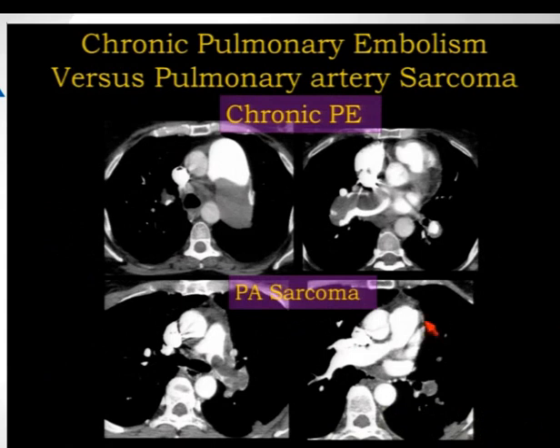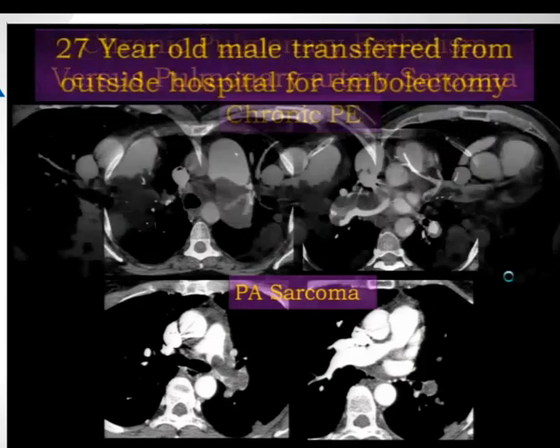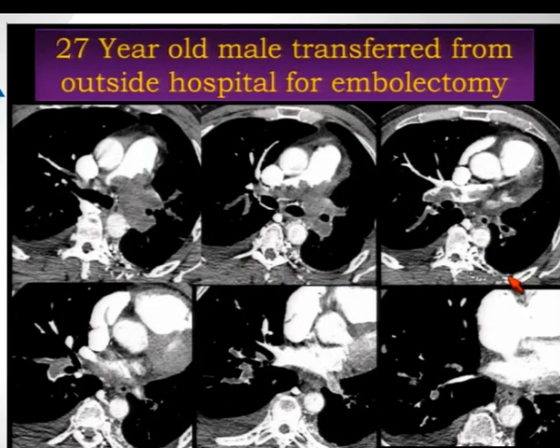They may have subpleural nodules or consolidation or pleural effusion. And I'm just showing you these two together. Some have said that pulmonary embolism tends to be smoother and show no enhancement. This may or may not be so, but that's something that you can use. This is a patient who I fell into the pit on. This is my Waterloo, and quite an unfortunate patient. There's a pitfall of tunnel vision, is what I would call it.